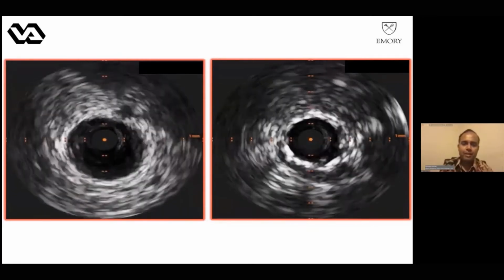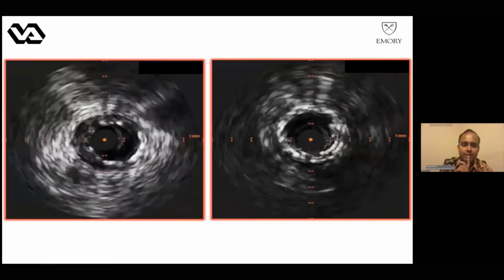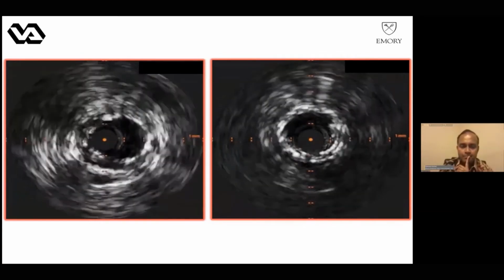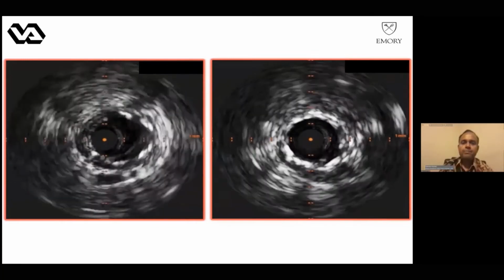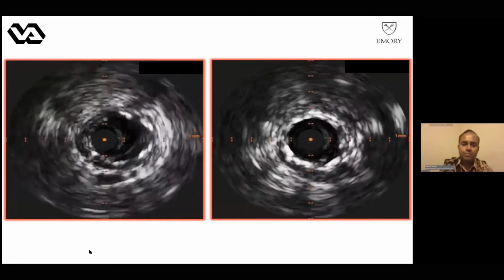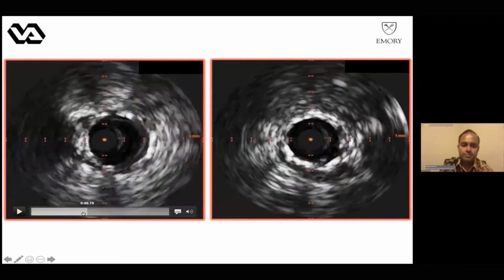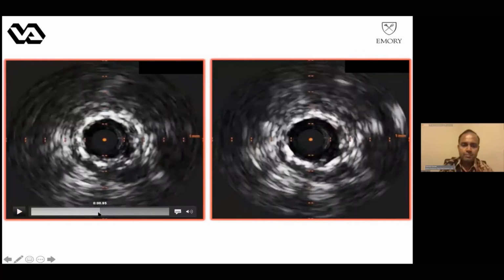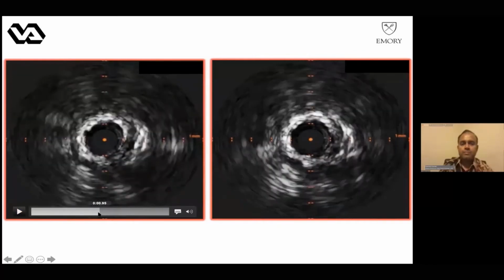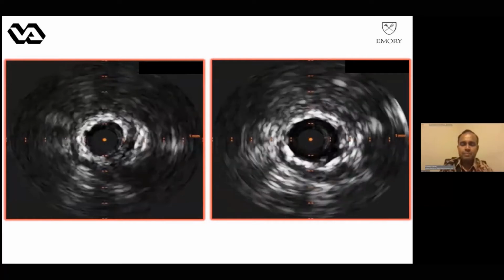This is a relatively short run from the outside hospital that we got. Sure. Even a short run, it's a very clear message. It's a very small stent area, and looks like almost the same size as the IVUS catheter. So this is a Volcano IVUS catheter. The stent area could be less than 2 square millimeters, which is super, super small.